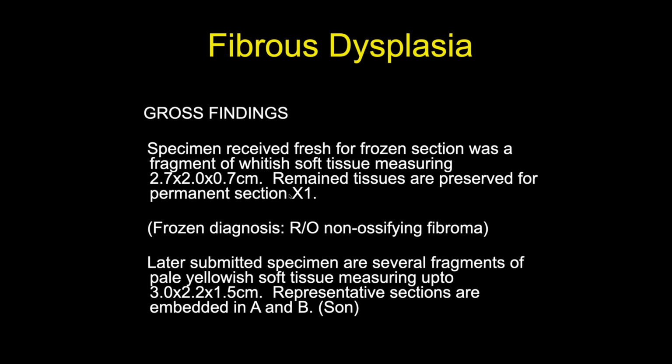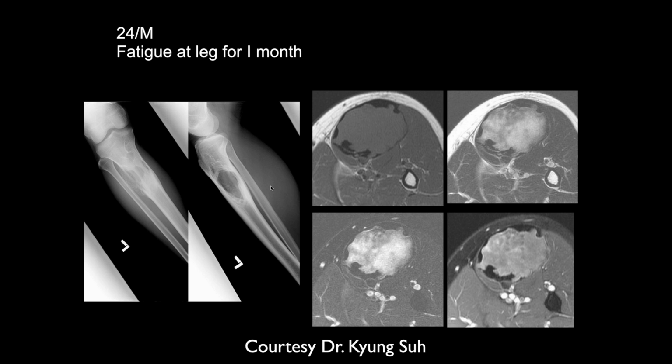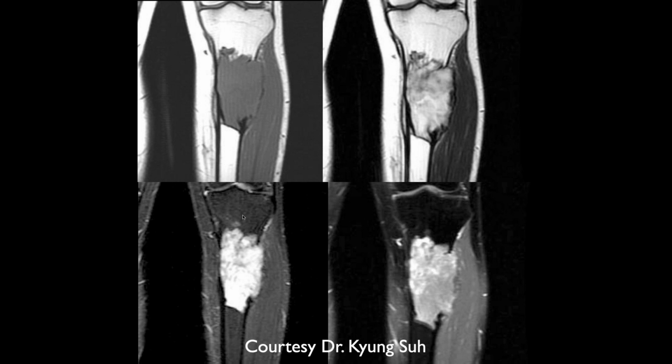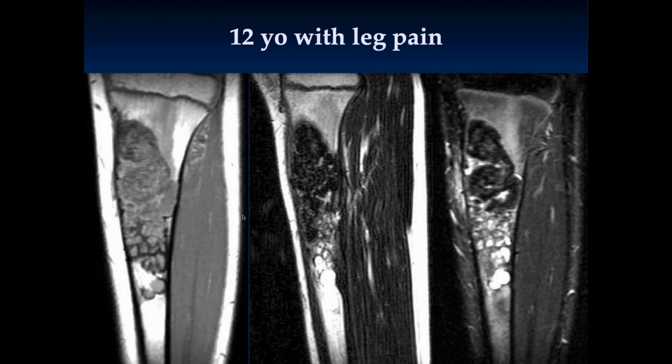Could it be giant cell tumor also? Yeah, I think it could be, though it's not close enough to the epiphysis. Nevertheless, I've seen one or two in this region. It's possible. Generally, giant cell tumors don't have this thick sclerosis. That's the only thing. Giant cell tumors don't have sclerosis that I remember.